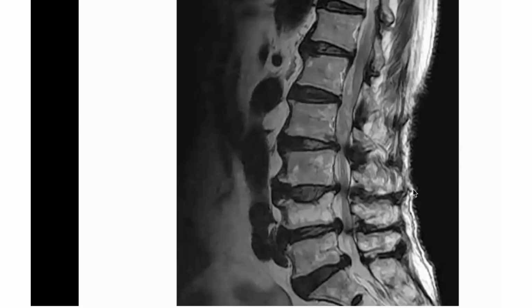Now look at this. You name any pathology, it is there. You have compression, you have degeneration, you have herniations, you have facet involvement, total degenerated disc, osteoporotic spine, everything is there. But if I say that this patient is not having any pain, he doesn't have any pain at all in this region. So that is also possible. You see every kind of pathology here. But all the pathologies may not be painful.